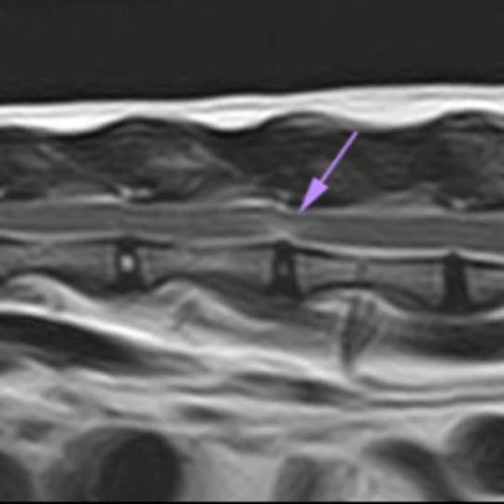Okay. I will just add, make sure you do a post-contrast study, especially with fat saturation, in this case, especially for the extrusion. I think it's quite useful to do. Unfortunately, we used the high field MRI only in the last 2 years of the study. So before, it was very difficult with a low field MRI. And the time as well, and so on.